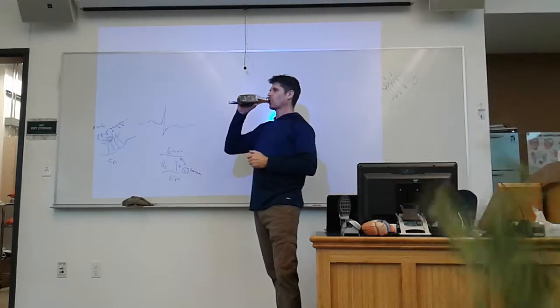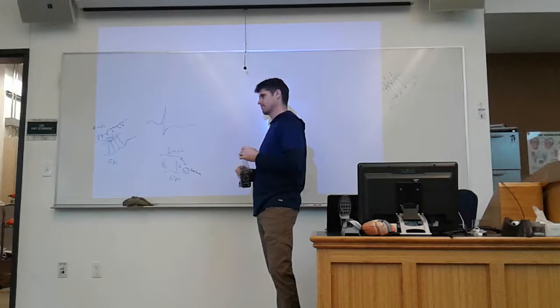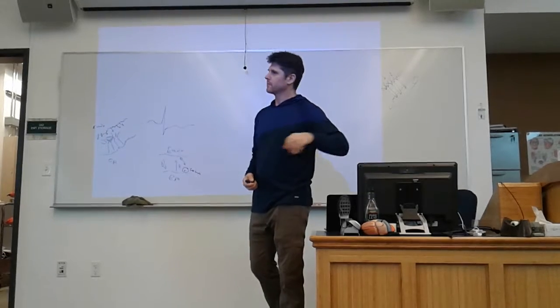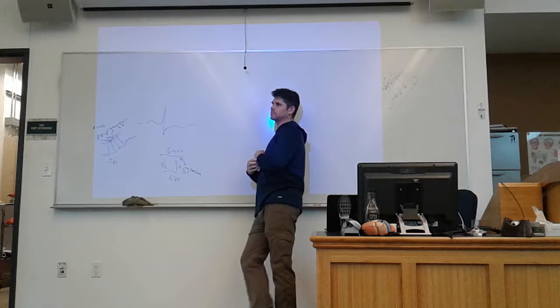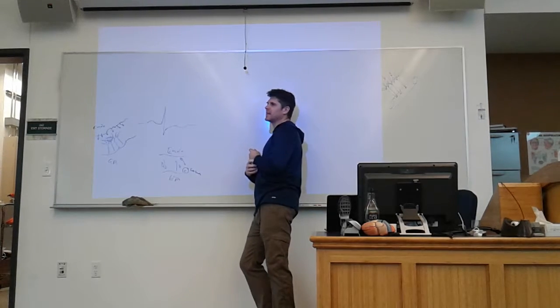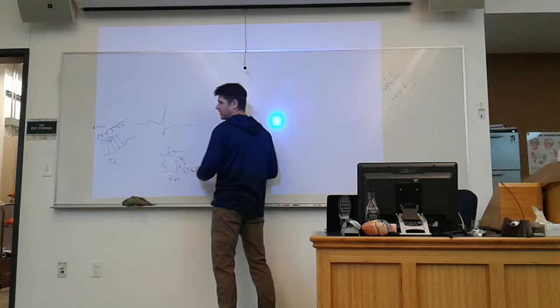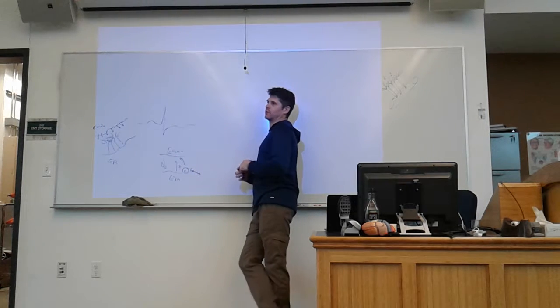Is that timing going to be the same? That lead is going to be delayed versus not delayed in other leads. So you couldn't just take your calipers and go to the lead where it's upright and not depressed, caliper that interval out and then move it to that lead. You can, because it's not delaying the overall end result process by much. It's just delaying those cells long enough that it ends up flipping the direction that the repolarization goes.